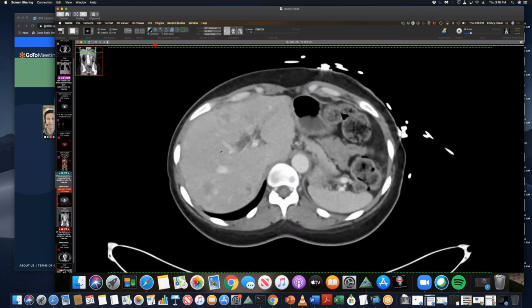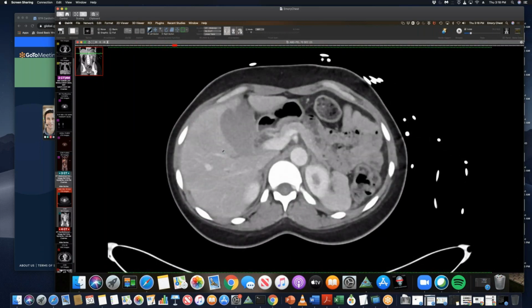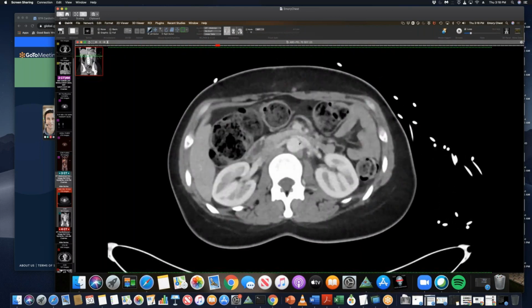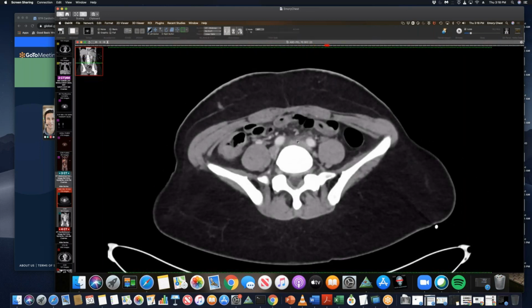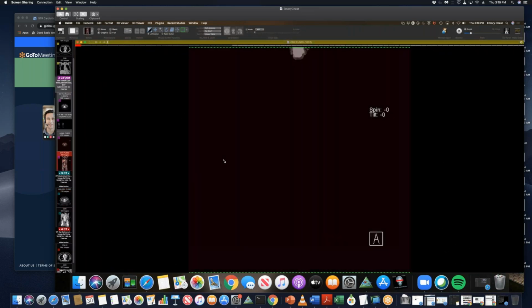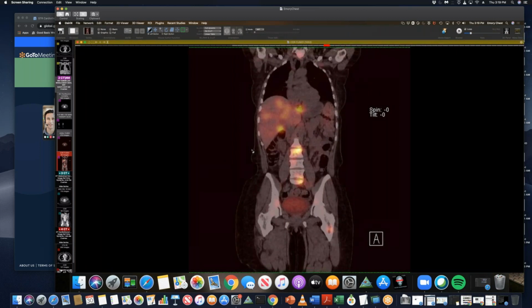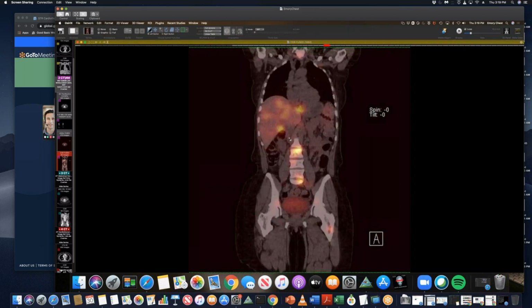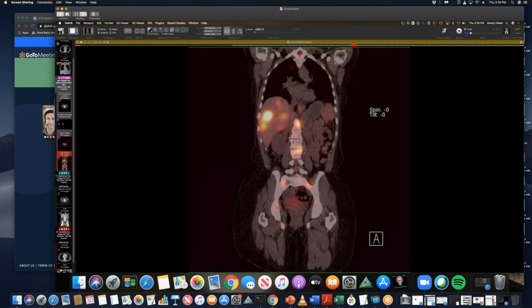And one of these liver lesions was biopsied, and the finding was a neuroendocrine tumor, most closely resembling a paraganglioma, which makes sense because these masses here are in the region of the organ of Zuckerkandl. And that was also confirmed with multiple MIBG scans done over the next few years. She was even on I-131 MIBG therapy, and she got somewhat of a good response.